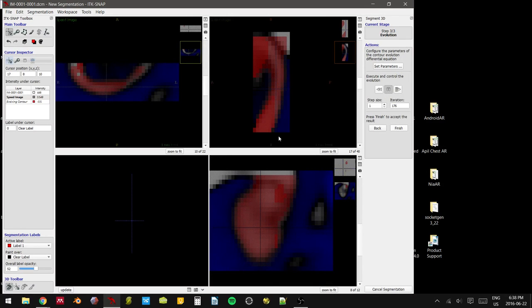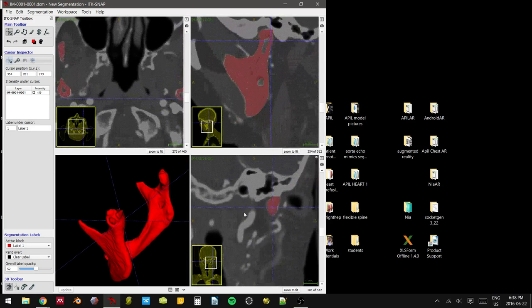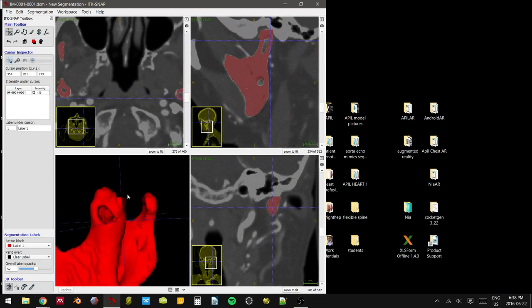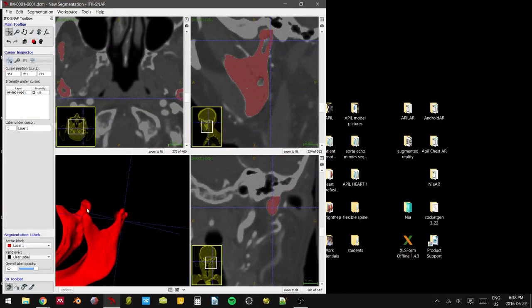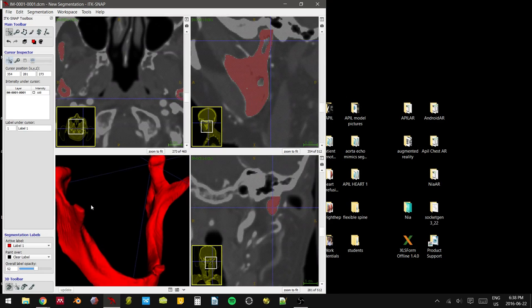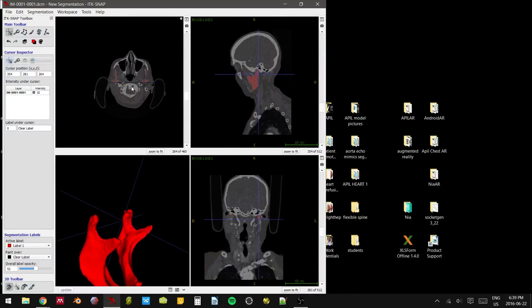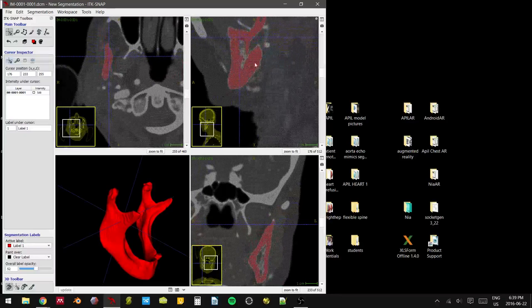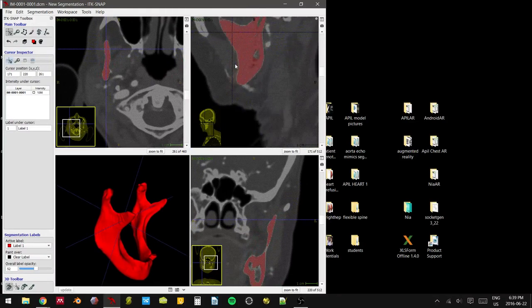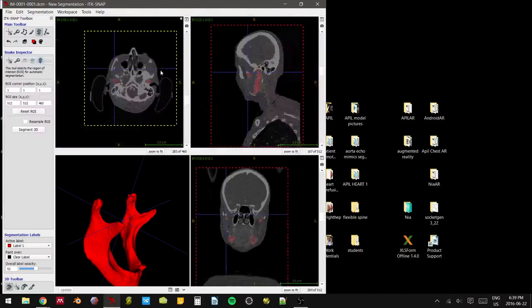Okay. Finish. It's going to be a little area that's been squared off. Yeah, you can see it there. I would go in and manually clean that up if I were you. Or you can just smooth it out in post-processing at a later date. What are we missing? We are missing something on the right-hand side. Ah, there it is. Reset.